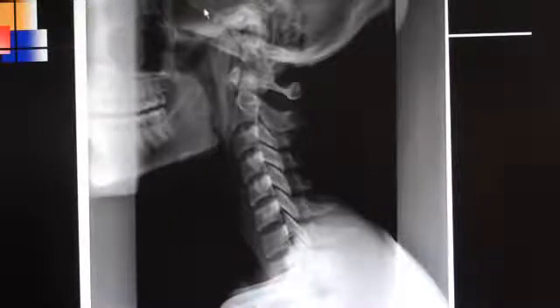On this film right here would be the Sella Turcica, and the Sella Turcica has two measurements. The first measurement is from anterior to posterior across at the widest part this way, whereas the second measurement is the S2I measurement. And my mouse just went away. Let's see if I can get that back. From S2I, from the superior to the inferior aspect. Now the normal range for A to P, anterior to posterior, is 5 to 16 millimeters, and the normal range for the S2I is 4 to 12 millimeters. The average for the A to P would be 11 millimeters, and the average for the S2I would be 8 millimeters.